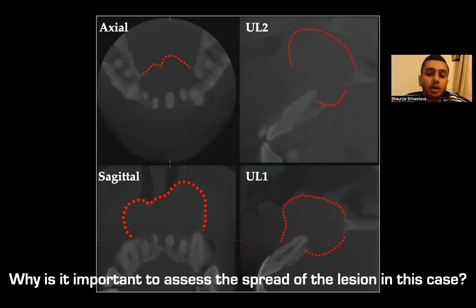Because, for example, I do the endo and it's not responding to the endo. And in fact, it is a cyst. We're going to have to get oral surgery into play as well. So we're going to have to assess the extent of the lesion to see what the anatomical landmarks are in and around. Am I confident as well to go through the surgery if I need to do one? So I'm not, to be honest with you. If a lesion is that big, I would have gotten the oral surgeon to come in, do the excision, and I would do the obturation required, right? So CBCT will tell you how far the lesion goes. Your 2 radiographs were not enough to tell you how far the lesion goes, okay?